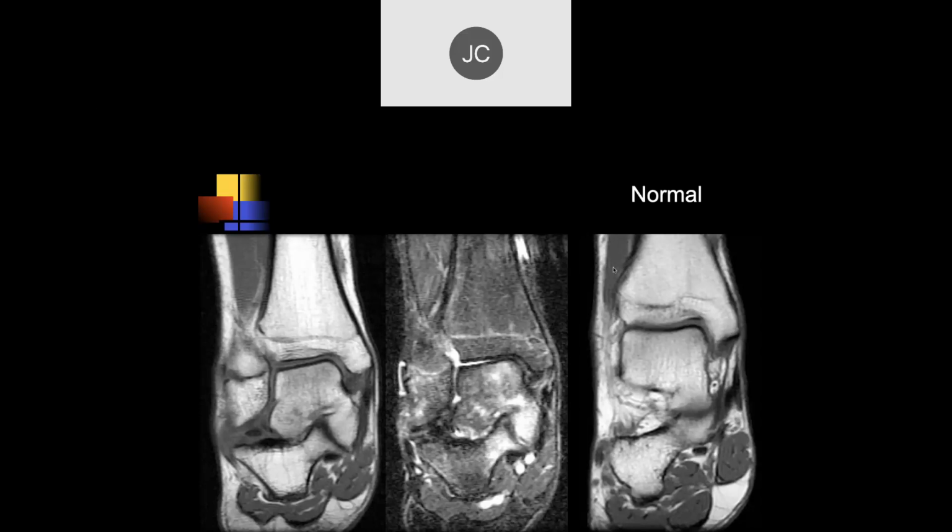But we're going to come back to that later. Let me see. Elior, what do you think of this case?